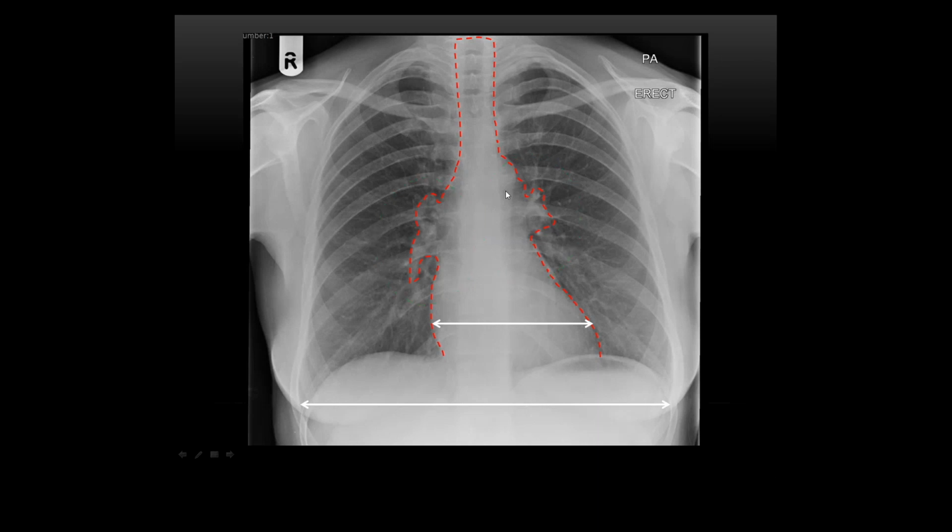And then finally, you want to be working your way further up, into looking into the superior mediastinum, looking at your trachea. So you want to be looking in this region here. This is what's called your paratracheal region. I don't know if anyone's ever heard of that. But the reason you can see this paratracheal region is looking back at the silhouette sign. You've got air within your trachea, then got the soft tissue in your mediastinum next to it, and then you've got air next to it. So in between those two air-filled structures, you've got a sandwich of soft tissue.